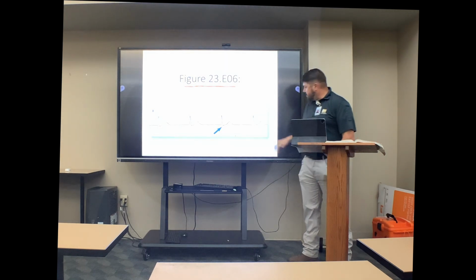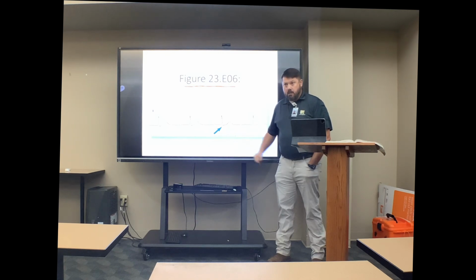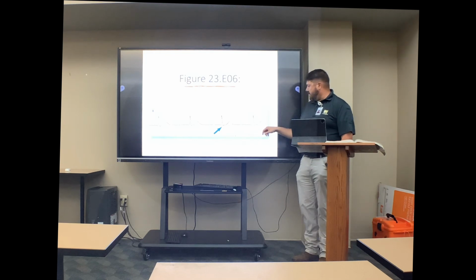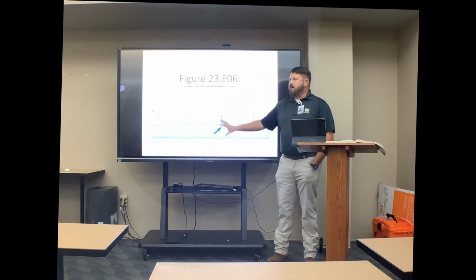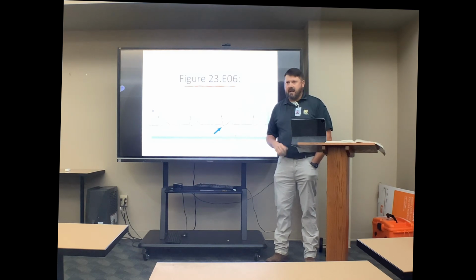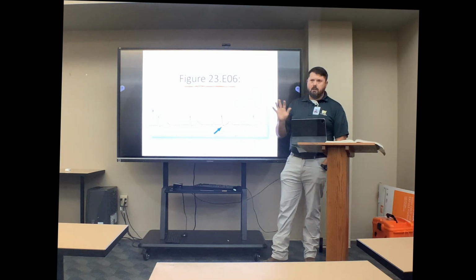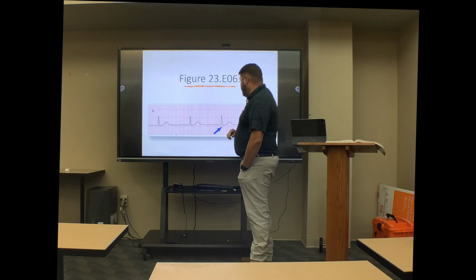Another one. Now this one is not as dramatic, but you can still see it. Be confident in these, okay? If this was the first time you ever saw this and we hadn't talked about post-QRS P waves and all that, I could very easily see how you would be like, I think that's just part of it. But there's a couple of things going on here.